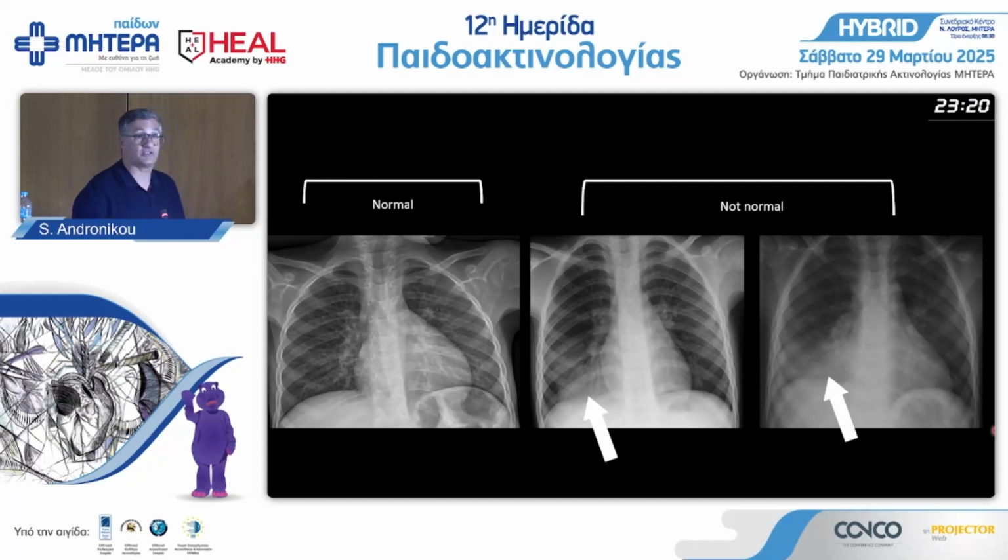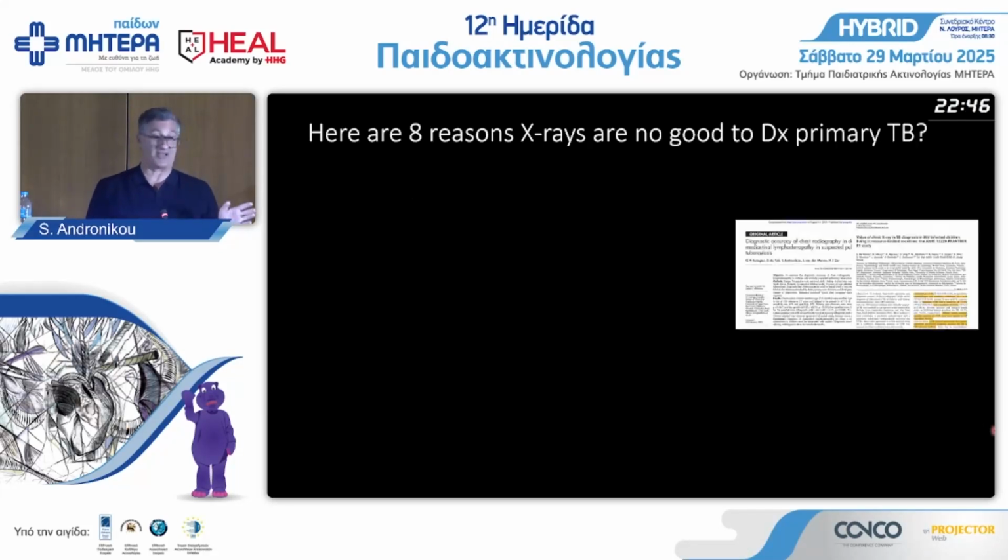And you need to do this because you think maybe that the clinician can solve the problem, but the clinician can only solve the problem somewhere between 10 and 20% of the time, where they can get sputum, most of the time they cannot, and where they can get that sputum to give you an organism, and most of the time they cannot. Okay? Even with new techniques, with Gene Expert and all the bronchial lavage, still the success rate is 20%. So actually you have to do it with the X-ray. That's the pneumonia, that's the TB, if you were wondering, and I'm not sure if you can do that yourself. Okay? It's a difficult job, and I'm going to try and help us with this job.